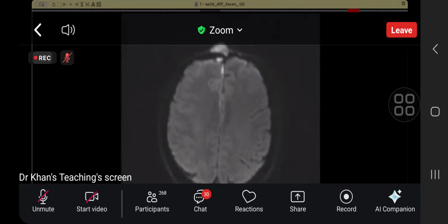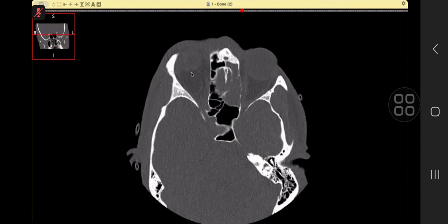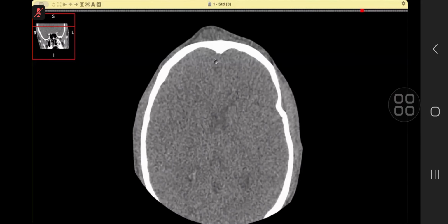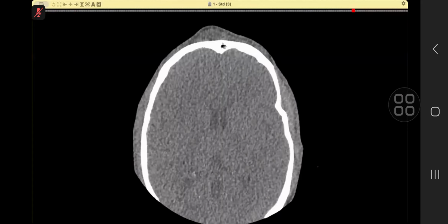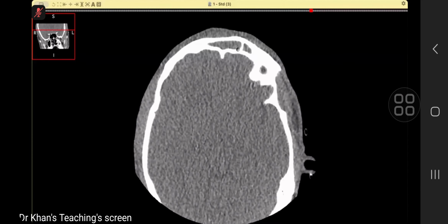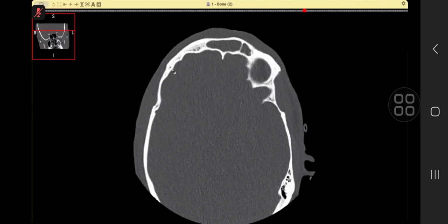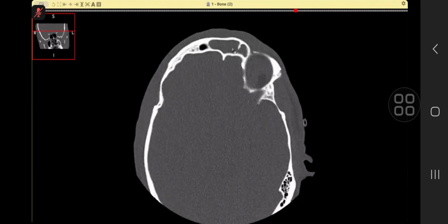So if you go back, the points to learn in this case are that we picked up the sinus and there was a swelling. One can ask for another window to see if we see anything, and the examiner might show you a CT with contrast, which was asked, I believe, but of course we did MR in this case, which is fine. But please remember the learning point in this case is that your pertinent negative or positive will be, is there a breach or dehiscence of the bone?